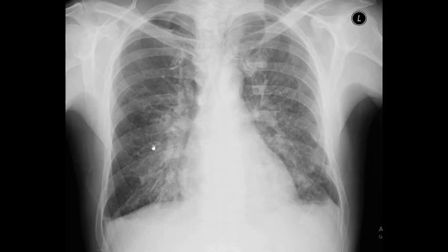Then we see how all of these markings, these vessels and the tissue around them, there is more white here that is not normal. It shouldn't look like this, it should be darker, especially in the middle and lower, and here also in the middle and lower lung field, there are many of these patchy white opacities present in these fields. That is actually pulmonary congestion or pulmonary edema. So these are bilateral diffuse patchy opacities that are forming.